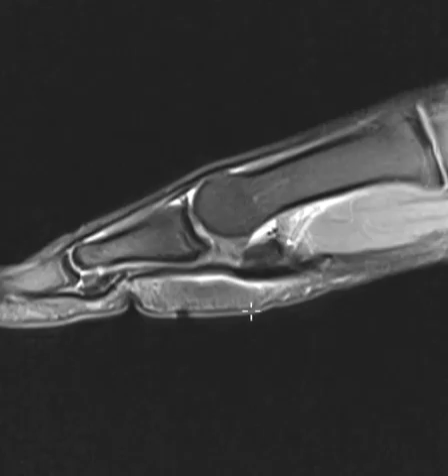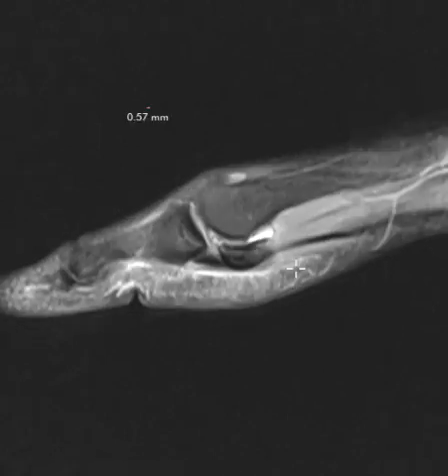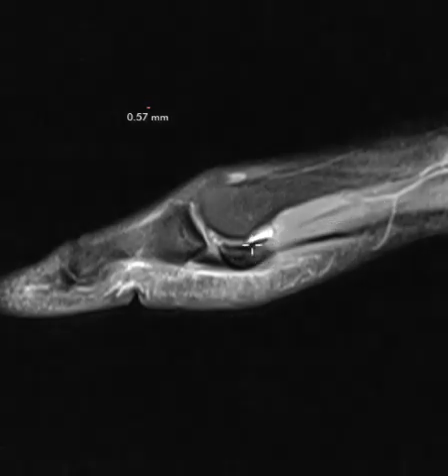Now this is a sagittal view. You can see the flexor hallucis tendon coming across here along the plantar surface between the sesamoids. If we go over to the abnormal one, this is the sesamoid bone, the medial sesamoid that's abnormal. A little bit of fluid here. We have the flexor hallucis brevis muscle coming down, and it just attaches right to that sesamoid bone. And then distally we have the sesamoid phalangeal ligament that comes off the sesamoid and goes to the base of the phalanx. This looks like there may be too big of a gap up here.